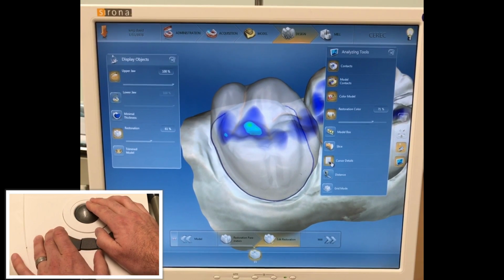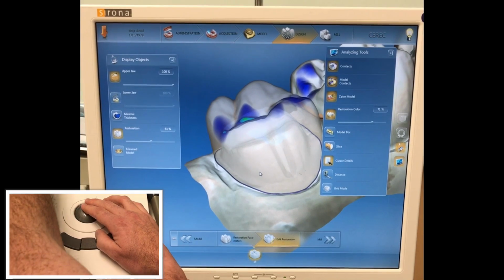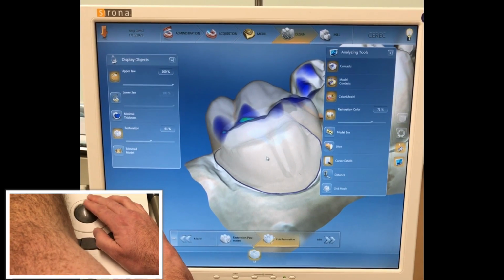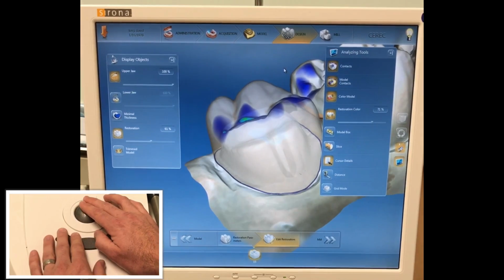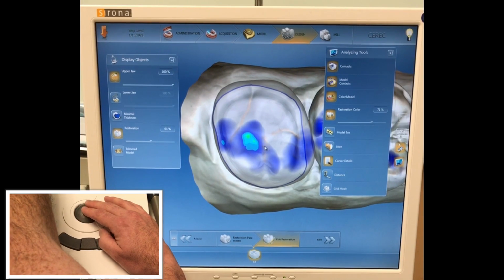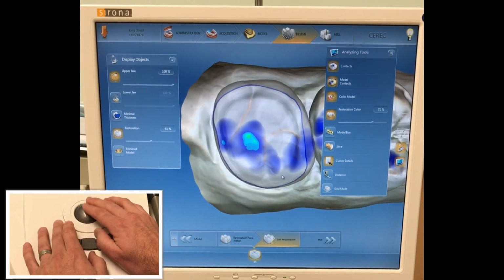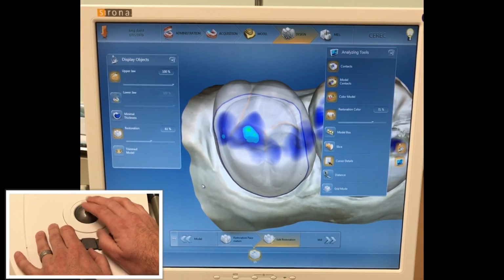You can also use the cursor details. So wherever the cursor is, as I roll up here, that'll tell me my thickness. See that number is rolling up and changing. It's going to hop way up as I'm down in that groove. And as we go over the occlusal, our height and our fissure height, thickness, plenty of reduction here. You know, depending on what you want for reduction, it looks like we have plenty of reduction there. You can actually leave this on while you're designing your restoration.